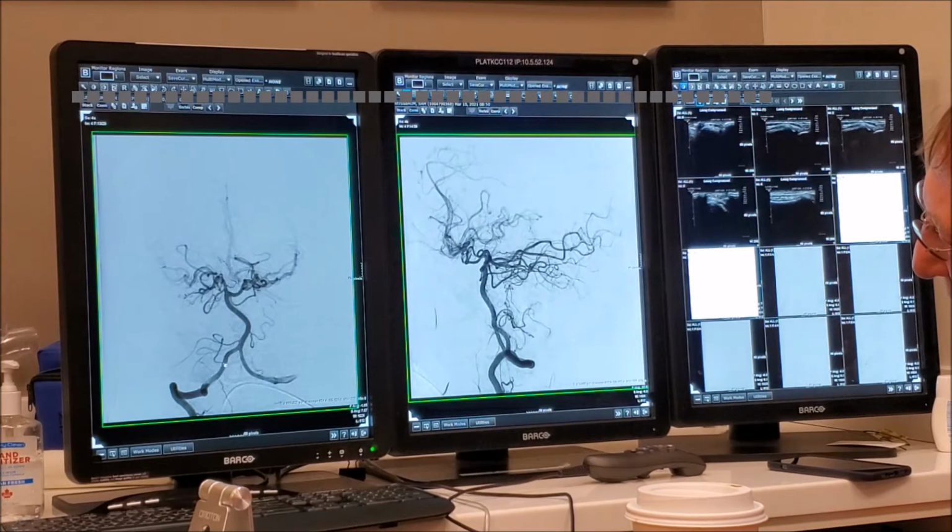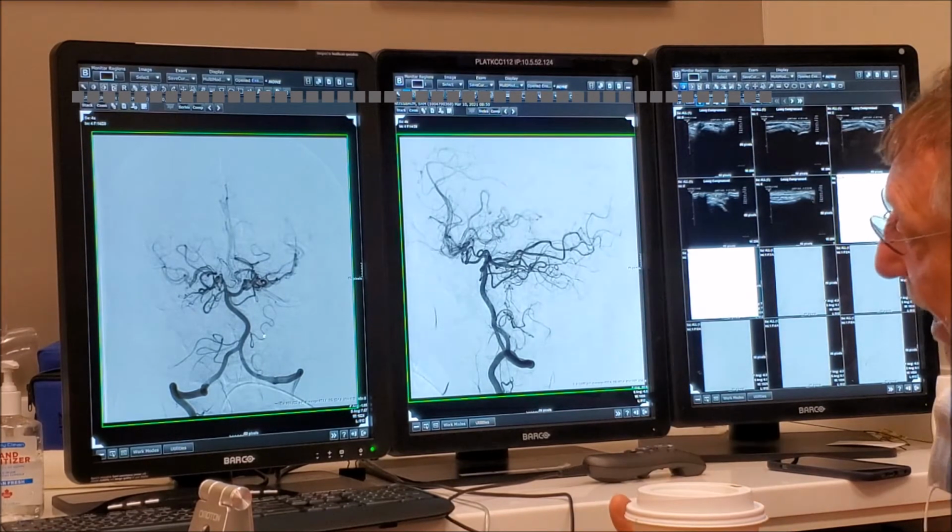And then there's another one here. So we call that one PICA, the first one AICA. This is at the lower origin of PICA, and this should then be AICA. And if I continue, it goes towards the auditory area, to the petrous bone. That's how I know anterior inferior cerebellar artery, right? Whereas here, there's a variant, which is actually quite interesting. And when I see this variant, I can make it a PICA, but I cannot make it a PICA and AICA.